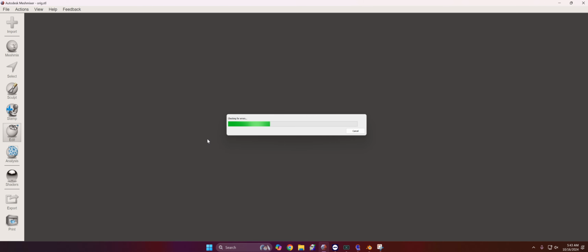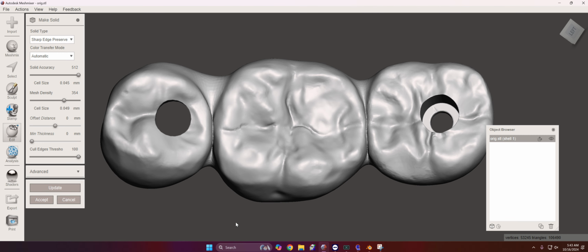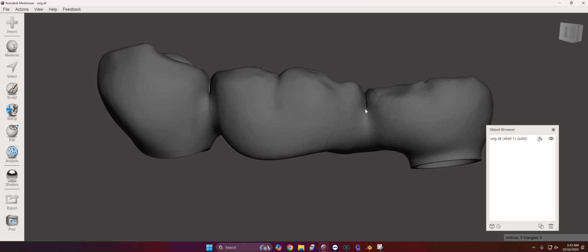So if you haven't figured it out, I'm going to bring it back into the B4D module to separate out a bar from this restoration. We're going to have a little bit of a backbone with titanium, and it's going to give us the opportunity to not be worried about that terminal fixture fracturing. All right? So let's go ahead and accept this really quickly, and you can see we'll have two things over here again. I'm going to erase this one, and now we have our unit.